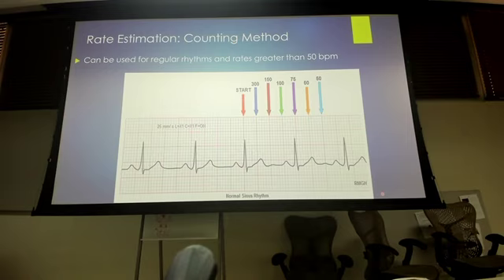It's 1/300th of a minute. Which means between this first black line and this next black line, it's 1/300th of a minute. If we go from this to this one, it's 2/300ths, and if you break that down, it's 1/150. That's how we get these numbers.